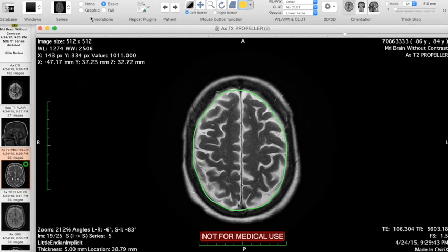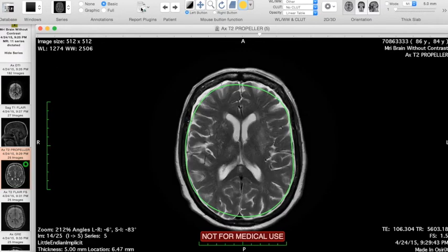It had the lightest and longest T2 signal, and so for this part, I found the MRI slices that had the clearest visualization of the ventricles, and then I used the exact same method of the polygons as before, as we did for all the brain tissue, just this time only encircling the ventricles. So I'll show you how I did that.